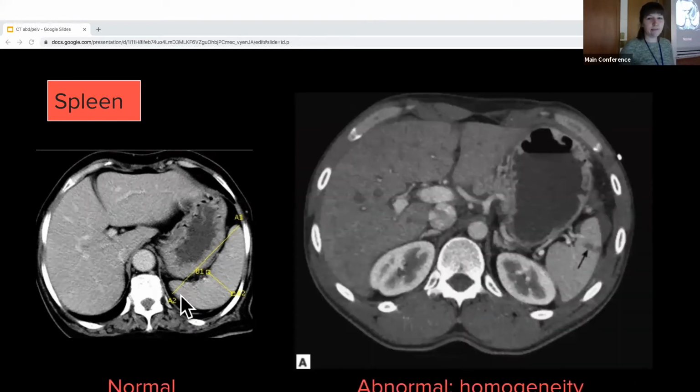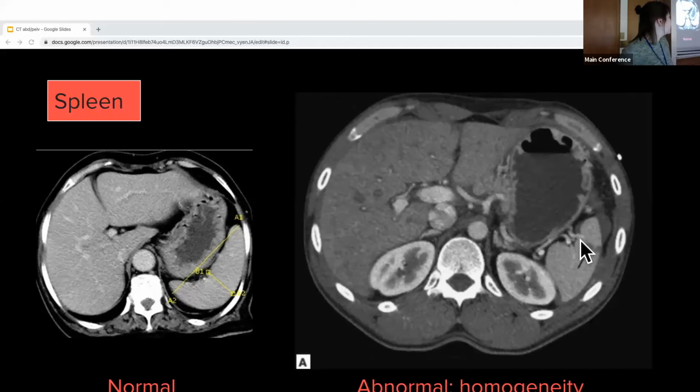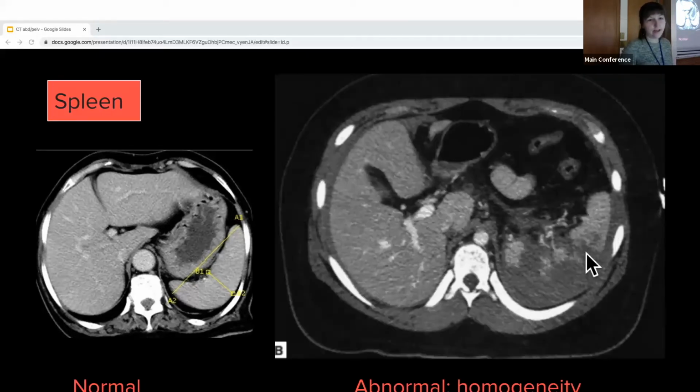So this is an example here of a splenic laceration in trauma. We see on the inside, the tissue is not all the same color, we see this area here, which is the bleed. And then this is just another splenic laceration. There are different gradings you can do, 1 through 5. The first one was a grade 1, where it's just very tiny. And here you have a grade 4, where there's very little remaining normal splenic tissue.